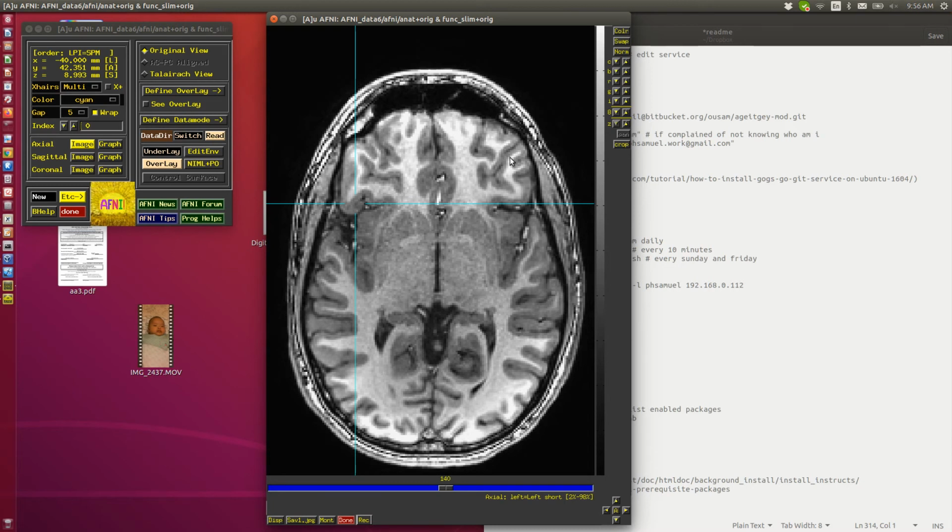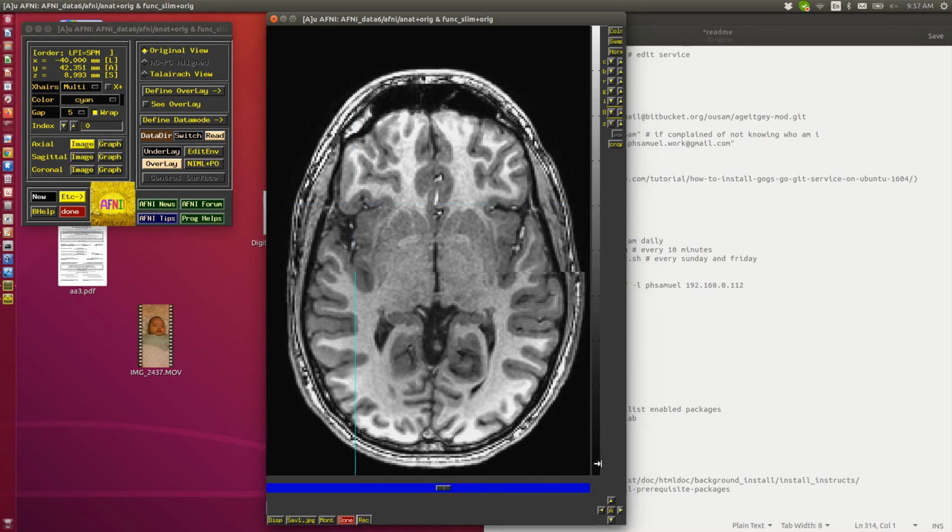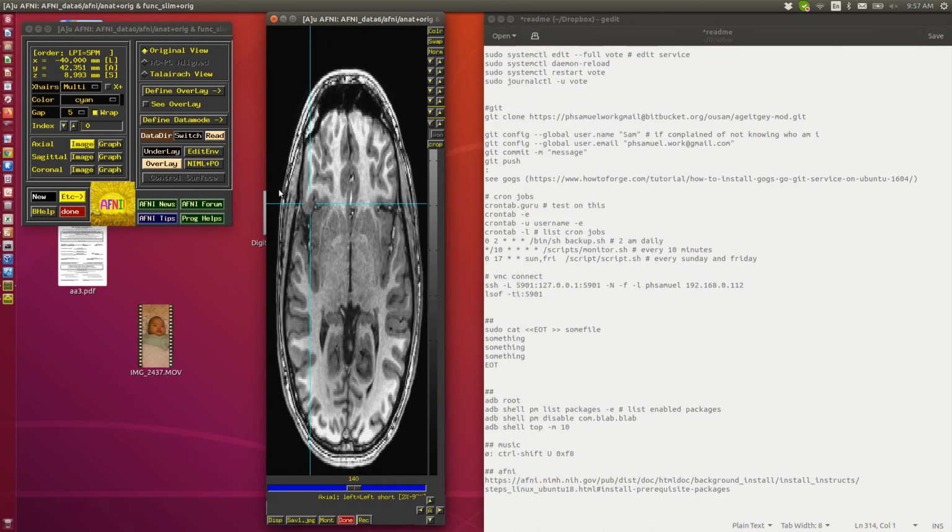Let's do one more weird thing, one more weird diet trick. Right there, I drag the window, and now the image has a weird aspect ratio. I won't complain about why this happens, but it happens. To fix this, there's a bunch of different ways.